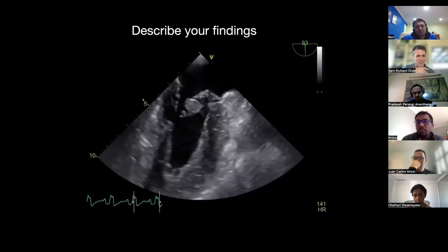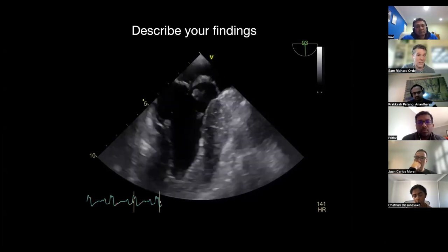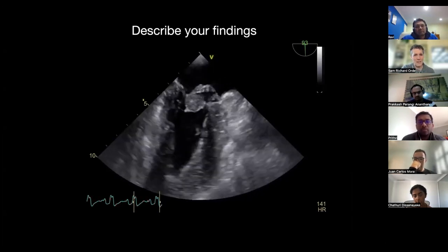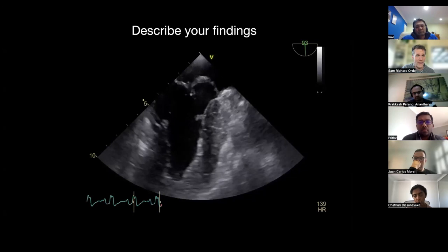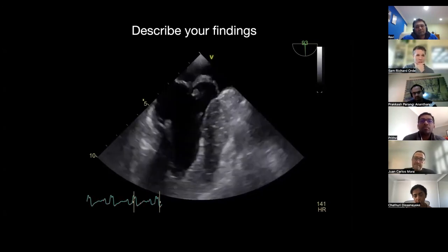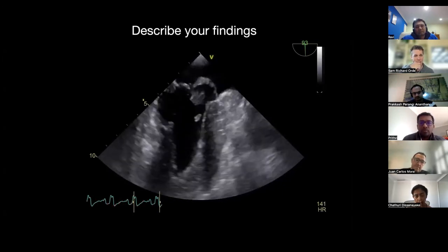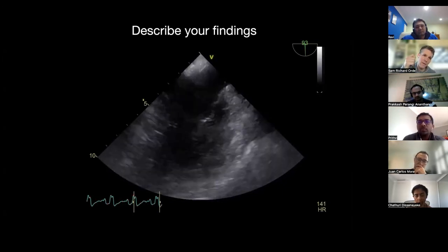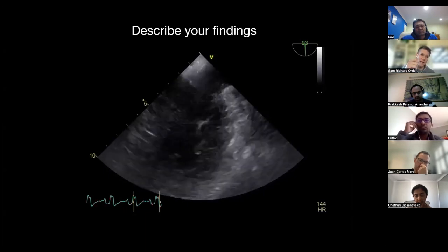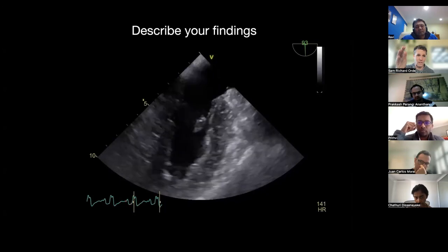It's unlikely to be associated with severe MR, but I hadn't shown you too many other pictures. So I think it's okay mentioning it, but that's a big lesion for a chordae. And with such a severe prolapse that we're seeing in there of A2, it's pretty punchy, I think. And the next thing to know, if we've got a ruptured chordae, it's got to have come from ischemia, right? Given the settings I just told you, this guy's had an infarct, right?